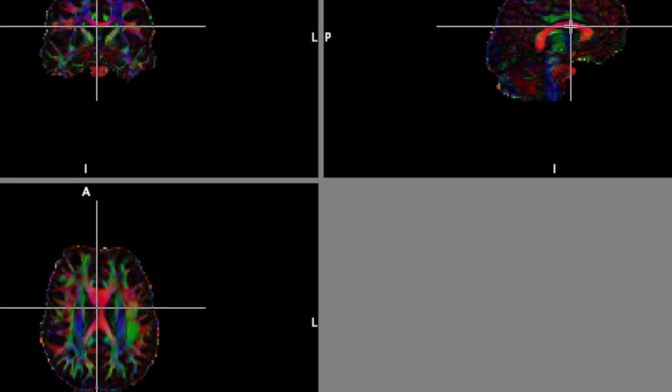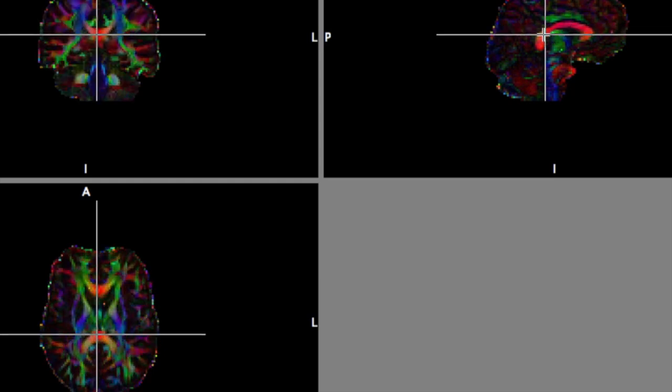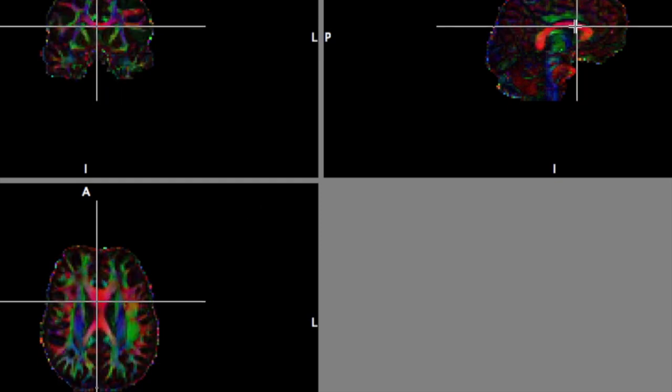after we've done this very basic DTI pre-processing, we have different color codings for where the direction of diffusion is. So for red, that's diffusion primarily along the left-right, or X direction in neuroimaging terms. And that makes sense, since it seems the heaviest along the corpus callosum, because those bundles of white matter tracts do indeed run primarily from left to right.